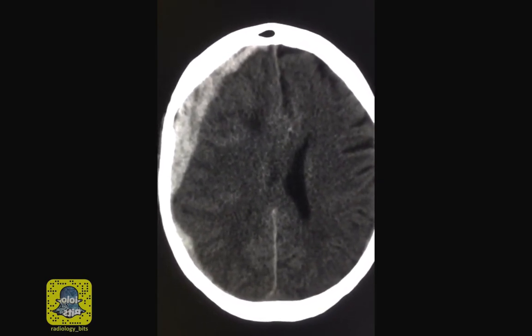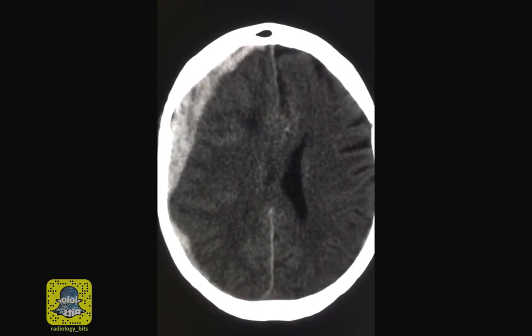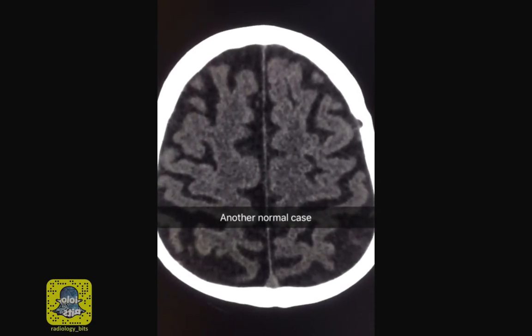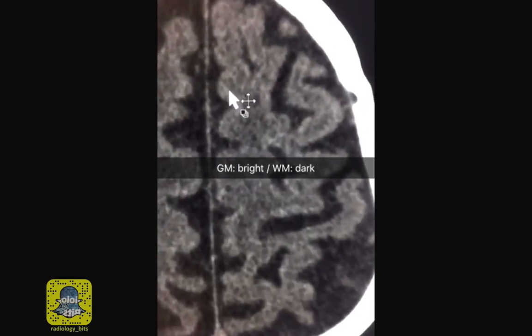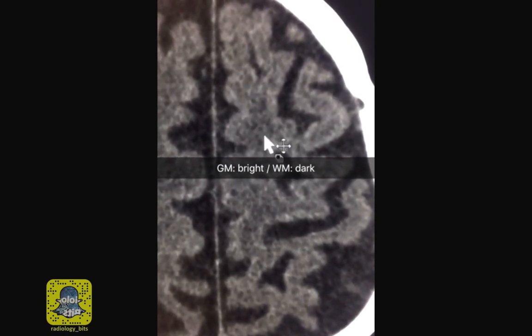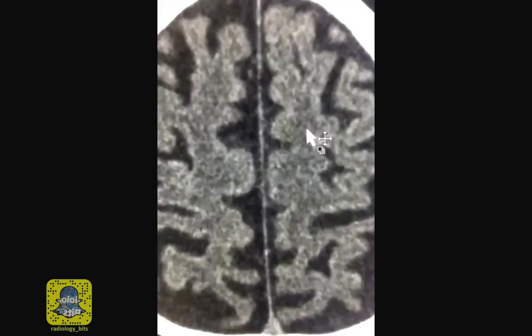Before we discuss this abnormal case, let's talk a little bit about basic normal anatomy. This is a different case which is normal. The first thing we're going to agree on is that you have gray matter and white matter. On a normal CT scan, the gray matter or the cortex appears bright while the white matter appears dark. So it's the reverse of what you expect.